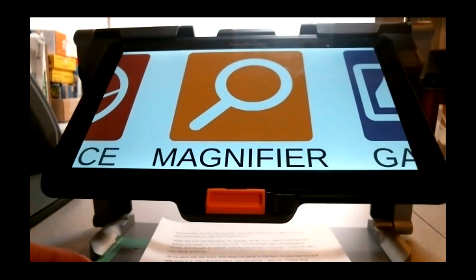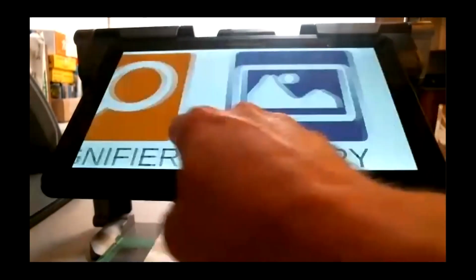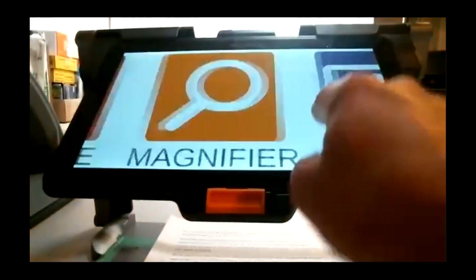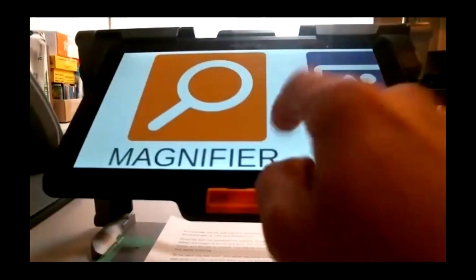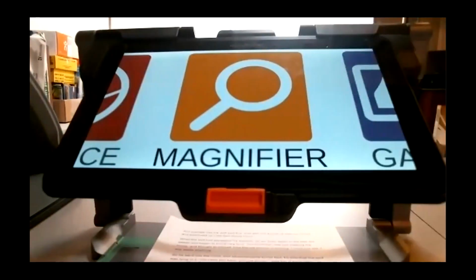That's one other gesture, another simple yet basic gesture. The press and hold, which is a kind of a tap, but you leave the tap on the screen. You have a panning gesture, where you leave your finger on the screen and you move it around up and down or right to left. That's another gesture. The famous pinch and zoom to zoom in or zoom out.